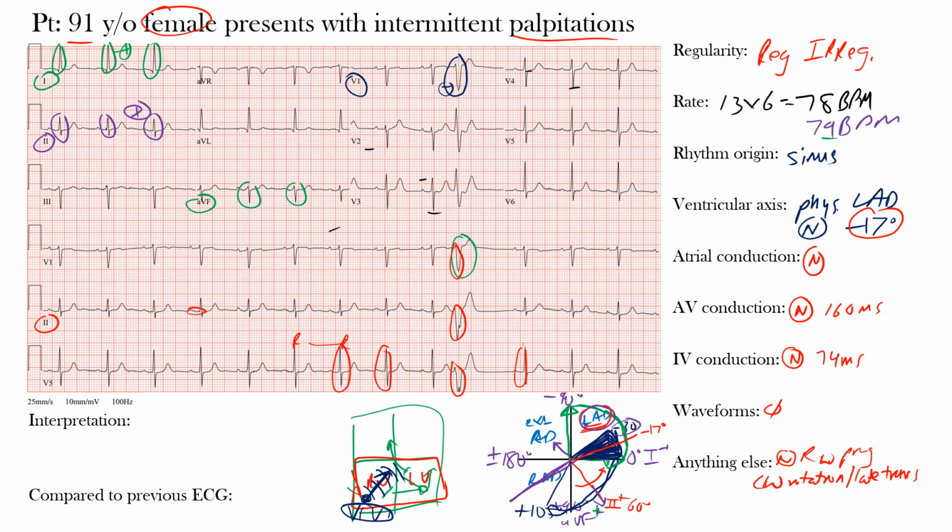Whereas if you have the left ventricle, which sits more posteriorly, and you have an ectopic focus, it's going to depolarize more anteriorly, and you'll see an upright dominant R wave. Okay, so a little more advanced, but some of you may like that stuff. Yeah, hopefully that was helpful.